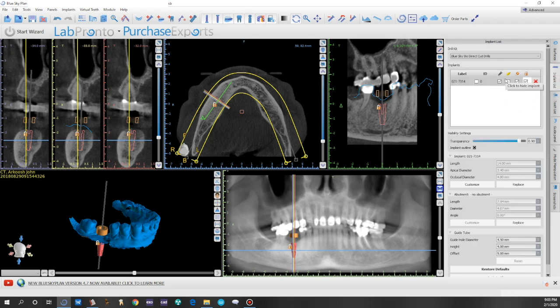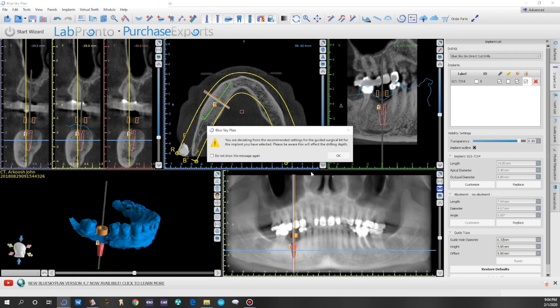So now everything's positioned where we'd like it. The guide cylinder icon is on, and you will program the cylinder or guide sleeve size and shape into the software. In this case, Straumann's traditional bone level tapered implant, the guide sleeve at its most outer diameter is 6.3.